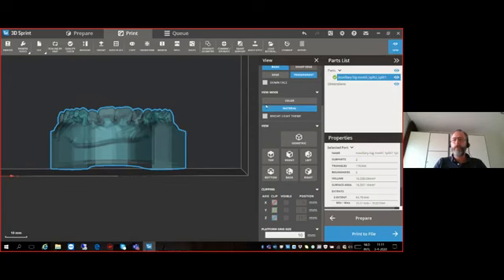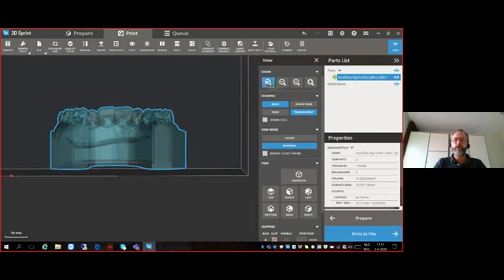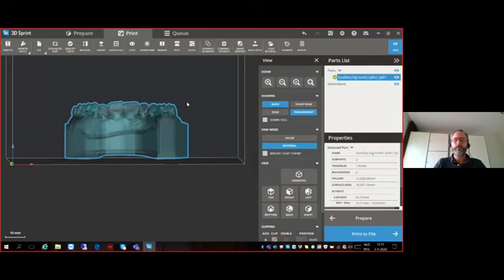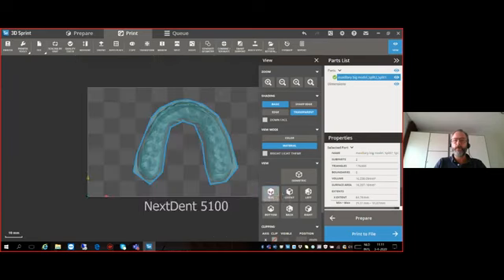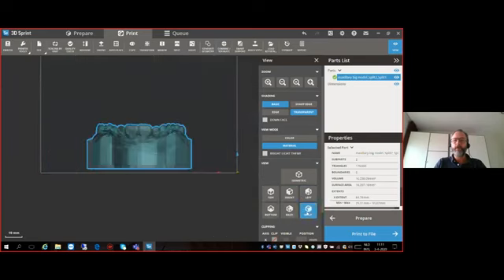When we open this window, we also have other opportunities. Here we have the opportunity to zoom. This can also be done by using the mouse wheel, which is my preference. But if you are used to using these kind of buttons, there's the option as well. We also have these buttons, which, of course, we know from similar software packages, you can select the different orientations.